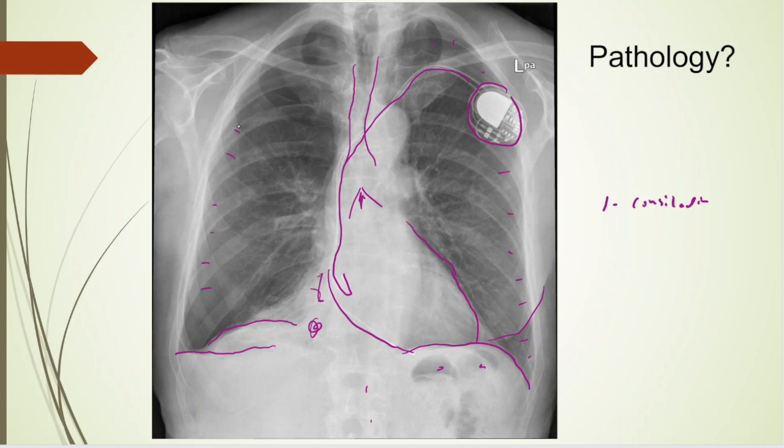Lung markings. But up here, you see the difference between the lung markings here and how this side doesn't have really any lung markings, and lung markings here versus over here. And you can see the pleura, if you look close, right here. That's pleura. So this patient has a pneumothorax as well. Looks like it comes here.